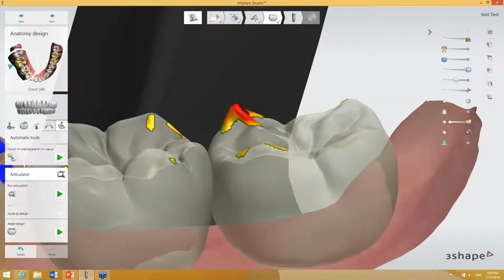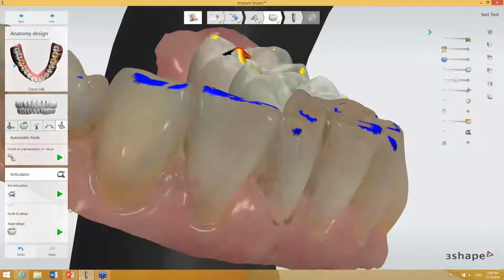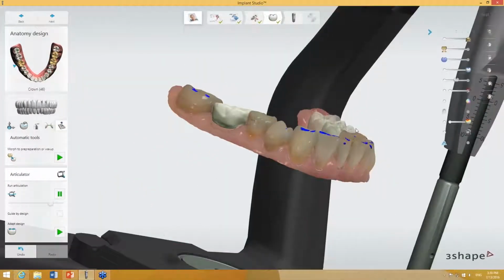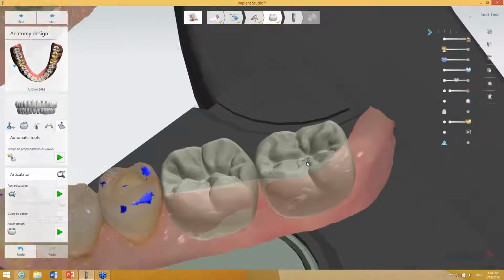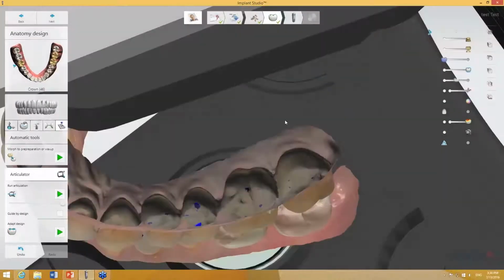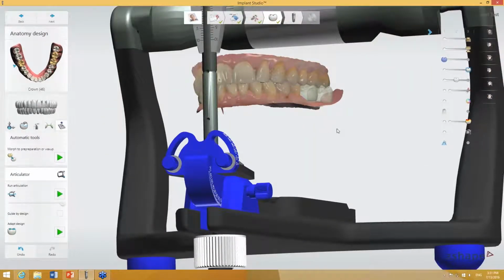And it doesn't matter that tooth 4-6 is highlighted as the active item. You might notice that on tooth 3-7, this cusp that was red is actually lowered. So if I make one more move in here, after adapting the design, right now it became slightly lower. There are just a few small contact points left. This design could be transferred and used directly by the laboratory for providing either temporary or final restorations from here.